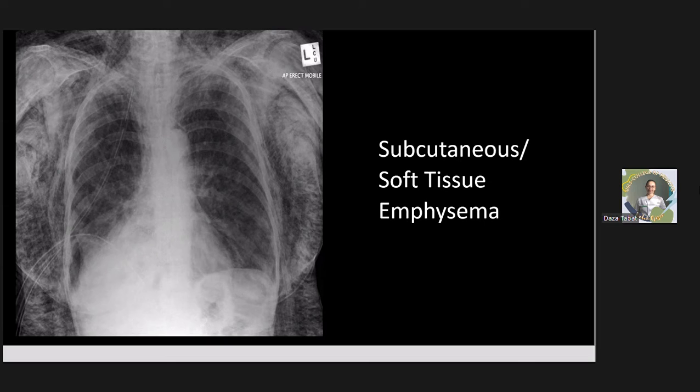If you recall the images I've been showing you, what color is the lateral chest wall? Let's talk about the lateral chest wall. What is its normal color? If you can recall the previous images that I've shown you, is it white, opaque or lucent? White. So if it's white, it's opaque. Yes, the lateral chest wall is opaque because primarily the cells are made up of fluid. I'm not sure, but around 70% fluid. That's why it would appear opaque.